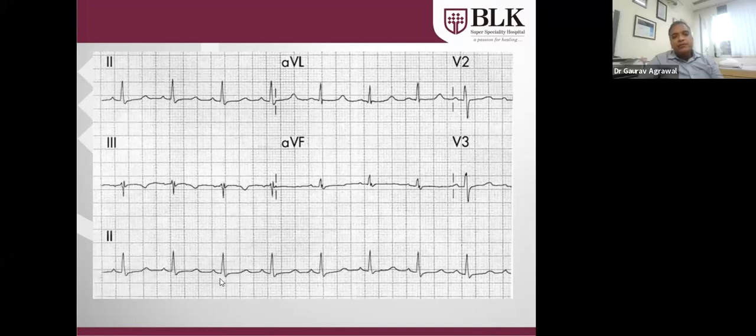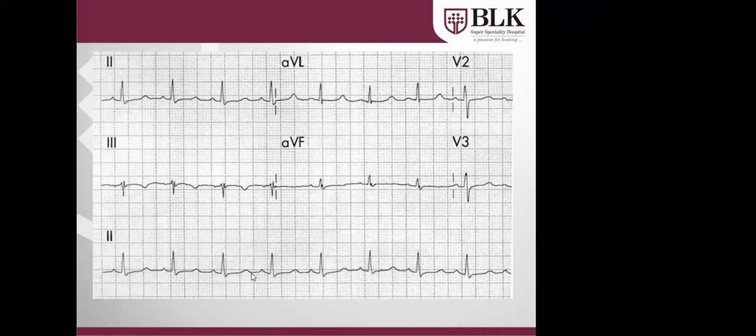QTc, you can see the QTc, the end of the T wave. This is another long QTc, as I told you.